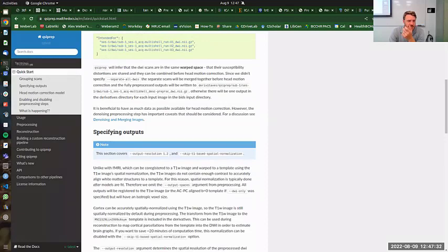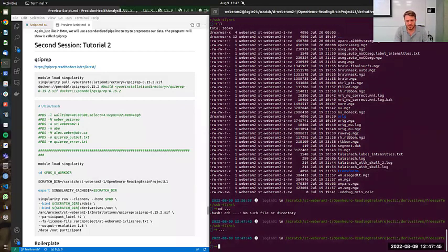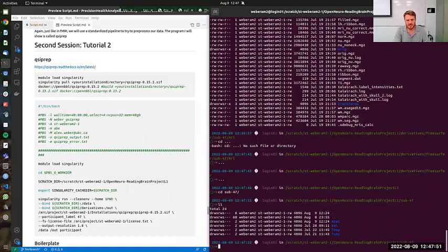Okay, so let's show you how to do this. It also operates with NIfTI files, yes, and again in BIDS format. So actually, let's look at what our files look like. Okay, so in subject 47, again, this is just the data we downloaded from the open repository.